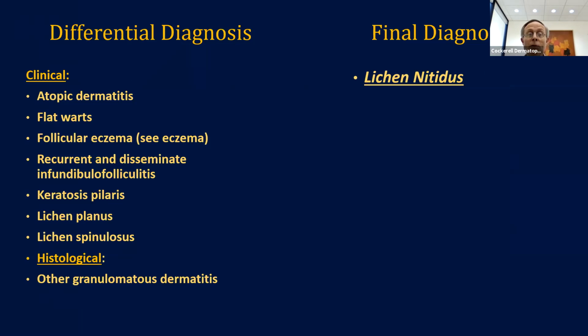Lichenoid drug eruption can do that. So lichenoid PPPD can sometimes be granulomatous. Sometimes a paraneoplastic process can be lichenoid granulomatous. Lichenoid granulomatous drug reactions can do that. And that's kind of it. So you've pretty much worked your way through that differential. It's pretty short. So just remember the differential diagnosis of those entities if you see lichenoid granulomatous.